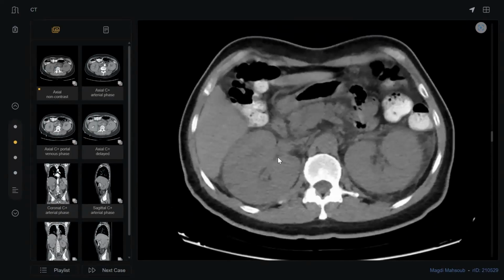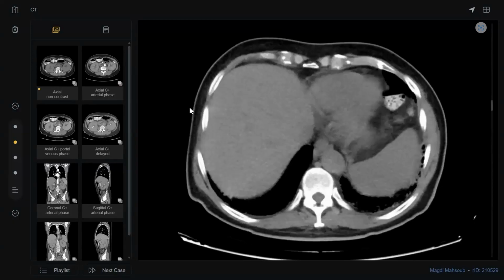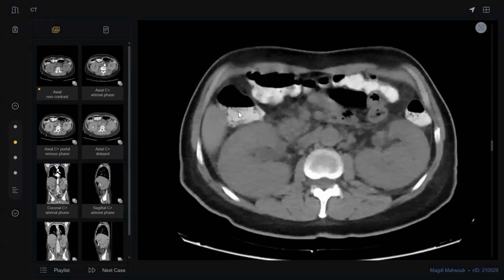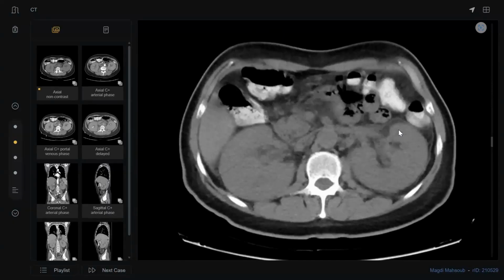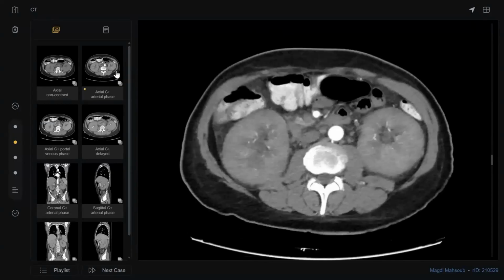This is impossible. You were very sure that you could exclude lymphoma. Why? Ask first for others. You look here, you find these kidneys are abnormal. Why? Look, most of the posterior half of the abdomen, if we divide the abdomen into anterior and posterior halves, the kidneys are really occupying the posterior half. Look here, all the bowel is displaced either anteriorly or to the middle. The kidneys look enlarged in size.